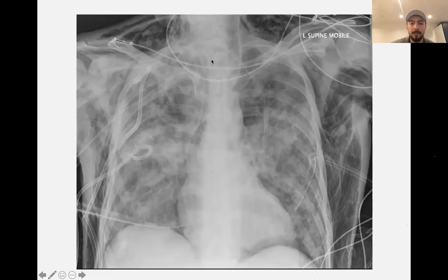Here, again, is a really complicated case of patient. You can try to analyze things, but because of these shadows, it will be a bit difficult. But you can, well, because the patient is clearly not in a normal situation, so they took the X-ray not in the best quality. So you can see the spinous process is a bit closer to the right. So the patient is rotated to the left side.